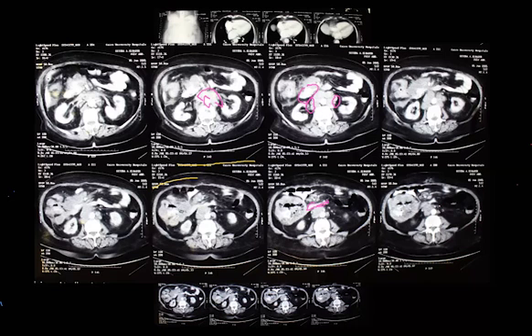What else in these films can we look at? In this CT, what else can we look at other than the para-aortic lymphadenopathy, to know its cause? What else may be big? The kidneys, maybe. But you're now telling me lymphoma or metastatic? You're talking about these things. What will help you reach whether it's a lymphoma is to look at the spleen. If you've got cuts, you better look at the spleen. What do you expect in the spleen if it's a lymphoma? It will be enlarged, yes. So there may be splenomegaly, which we will take into consideration.